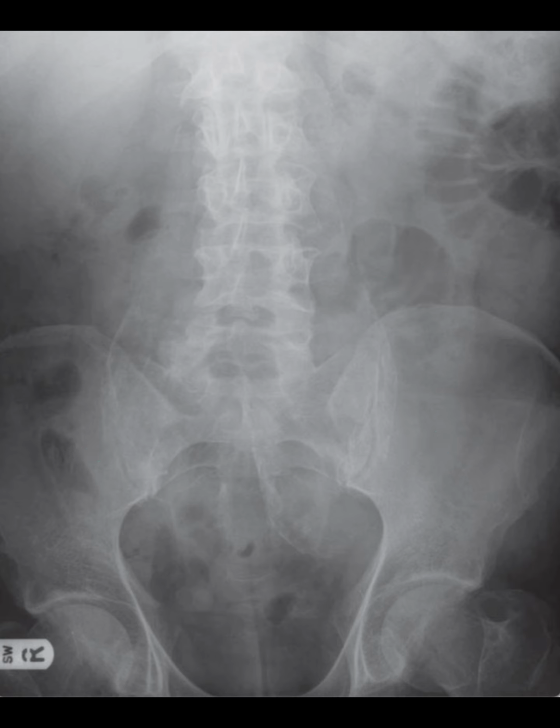In summary, on every abdominal plane film, I look for evidence of calcifications within the aortic wall and scrutinize the psoas major outlines for any abnormalities. Recognizing these signs early can be life-saving, as prompt intervention can prevent complications such as rupture.